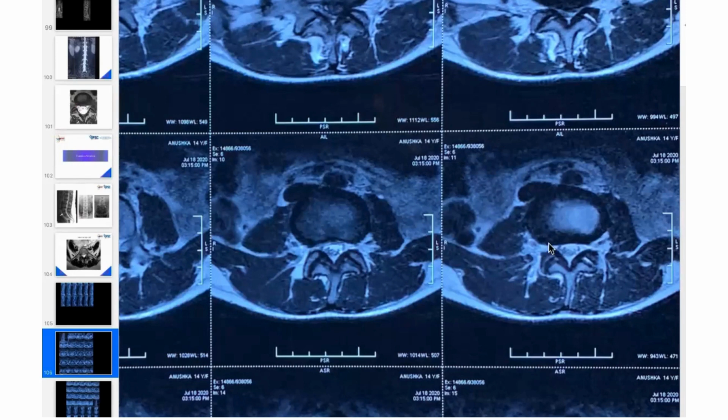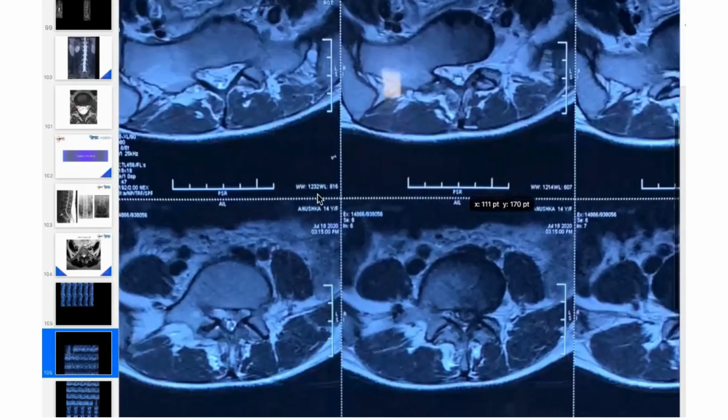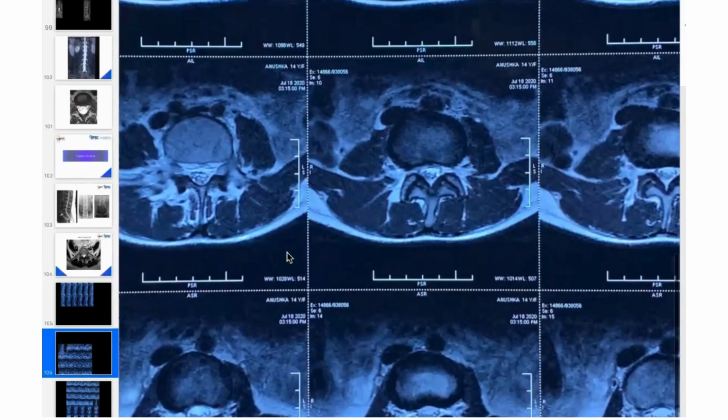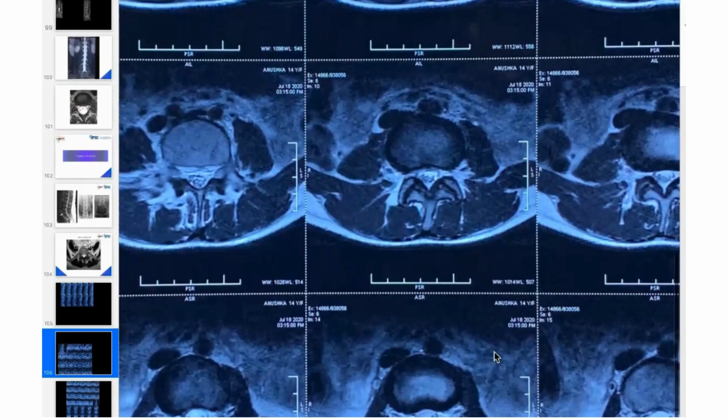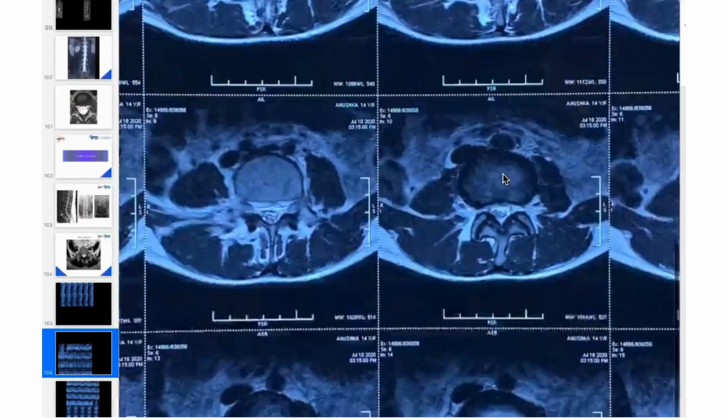Understood? Yes. There is a concavity which is maintained in the vertebral body and also in the disc. This concavity is not a feature of the L5S1 disc. So if you see such a kind of disc at L5S1, that is not a herniated disc. This is a normal feature of the L5S1, whereas all other discs are concave. Look at this. All other discs are concave.